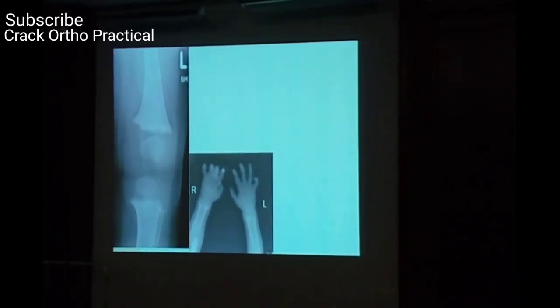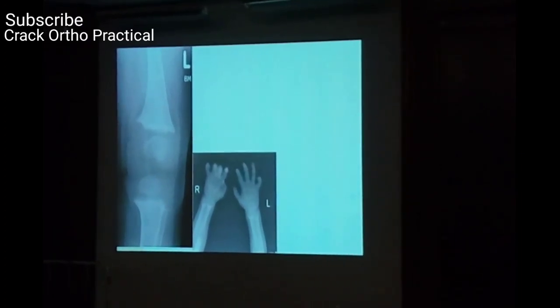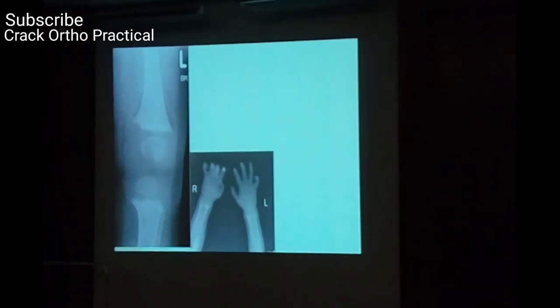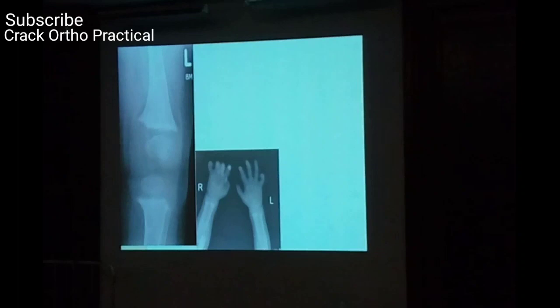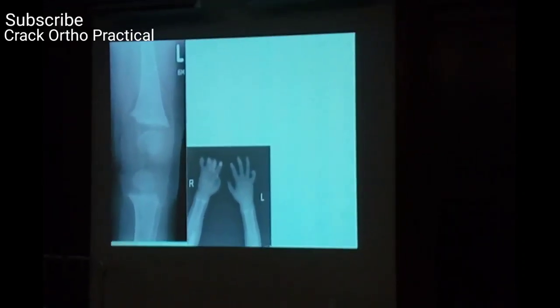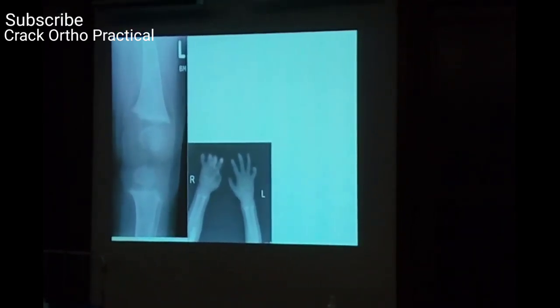Widening of a metaphysis, then it's okay, you don't decide, it's the same thing, I think. Good. So basically widening, irregularity, cupping, splaying and fraying.